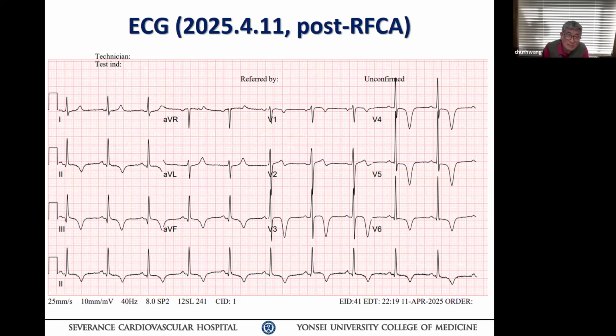Okay, so basically the patient has what? EKG: sinus rhythm, left atrial enlargement, severe repolarization abnormality. Why do you see this waterfall T wave? This is what? Could it possibly be pacemaker memory and left ventricular hypertrophy? Or is this truly some bad thing going on? What do you think?